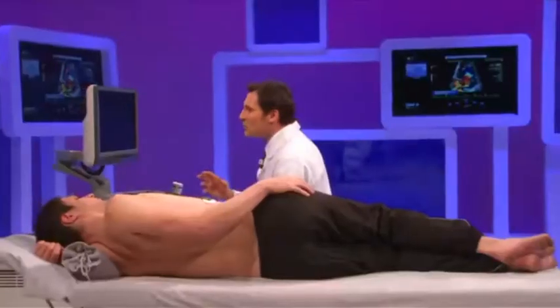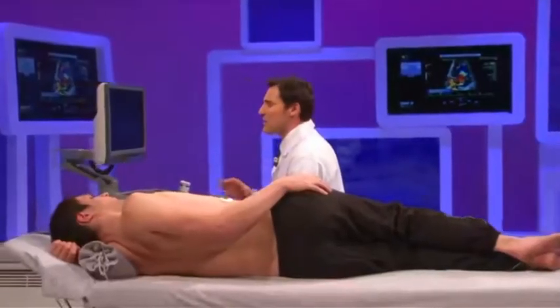And in this situation, 38 is almost close to 40. So we can say that we have moderate to severe mitral regurgitation according to the effective regurgitant orifice. And you know that the cutoff is 40. Below 40, between 20 and 40, is considered as moderate.